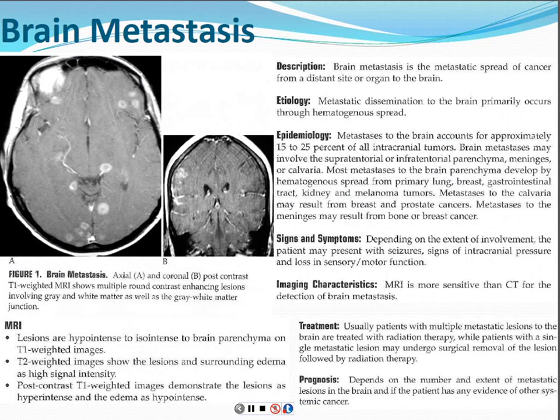So the first thing we're going to talk about here is brain metastases. Like in the liver, often cancers can spread to the brain. Sometimes it'll be just a single lesion that you'll see. Sometimes you'll have many lesions all around. It's kind of easy to figure out if you see a lot that it's a metastasis from some cancer. And this may be the patient's first presentation.